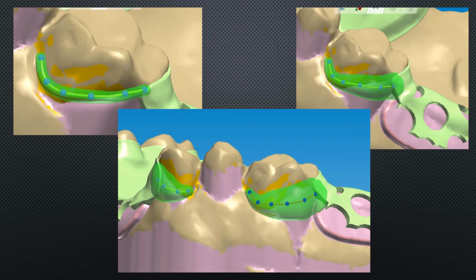Also, keep in mind when this material comes out of the mill, it's very nice to work with a handpiece and adjusting it. Grinds beautifully. When you're first starting to design these, don't be afraid to make things just a little bit heavier on your clasps, and then dial it in and fine tune it, and go ahead and measure them. Use your waxing calipers and measure what you end up with, because you can make them just a little fatter and a little bit less broad. If you have a doctor who says, hey, I don't want these touching the tissue at all, then you can adjust. It's one of the cool things about this material.